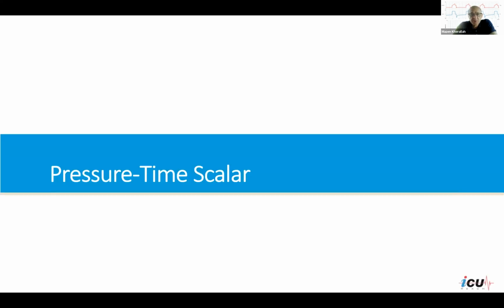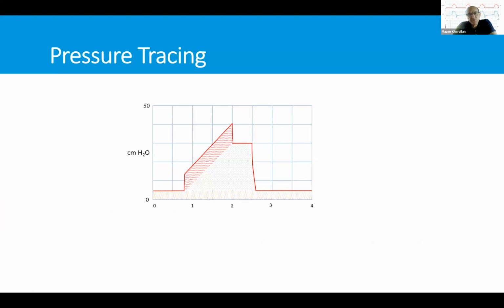So this is an introduction. Now we're going to look at the pressure-time scalar and see what kind of interpretation we get from it. Of course, most of this is known to you, but I may point out certain features that may be new to you. Just to make sure that we understand it very well, the initial rise in the pressure here is where the inspiration starts.